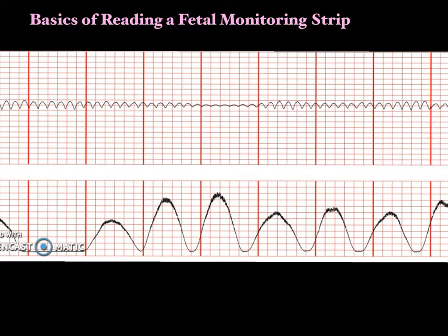That's what fetal anemia looks like. It looks like a sinusoidal pattern. And so we really want to assess what's going on here. We've got to get our hands on the belly. Mom's usually in a lot of pain at this point. If she has an epidural and she ruptures or abrupts, we might have a masking of symptoms. So if you see this pattern, you need to respond to it. And typically what's going to happen is you're going to need surgical resolution of this very quickly. But that's a sinusoidal pattern.